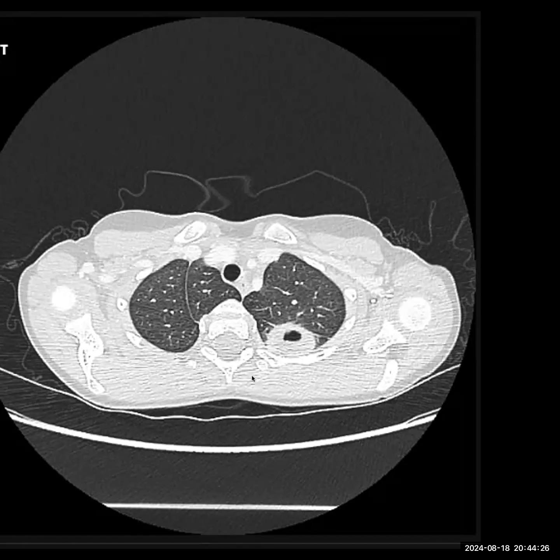But the fact that the lesion is seen in the upper lobe makes me think otherwise. I would have expected something along the lines of periphery and lower lobe in case of septic emboli. If it was a case of Wegener's, I would have seen a history of associated sinusitis, and in the upper paranasal sinuses, I would be seeing signs of erosions, and whatever fits the picture in whatever differentials you're saying.